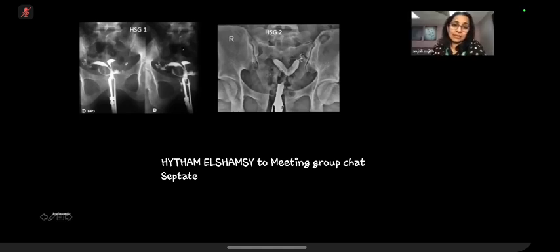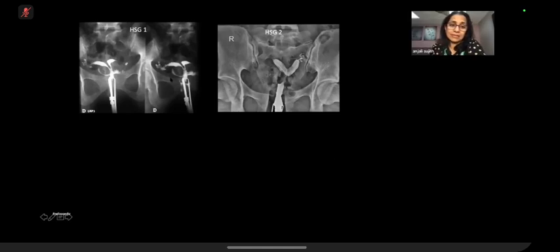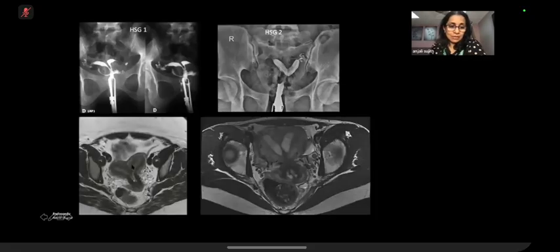Excellent. So if you're given this, again, you have identified it is a Mullerian duct anomaly. And then the key component here is the external uterine fundal contour. And as in any Mullerian duct anomaly, I would like to look at the renal status as well. So here you have the MRI.